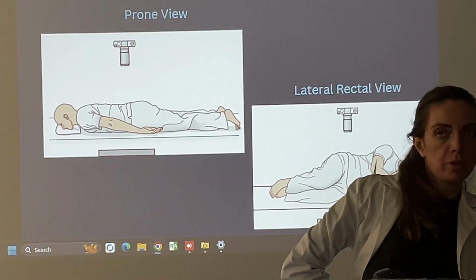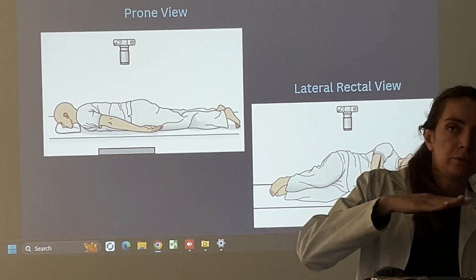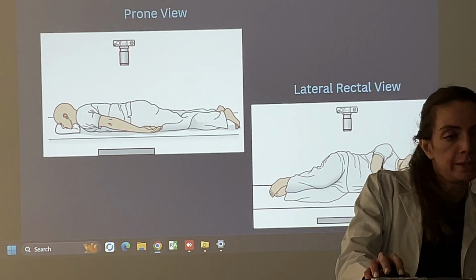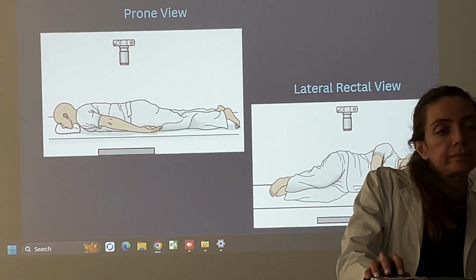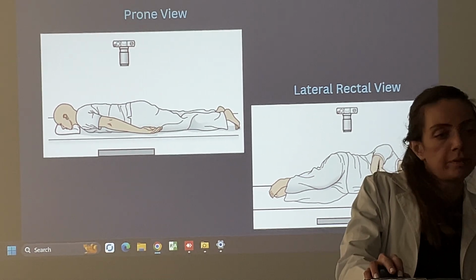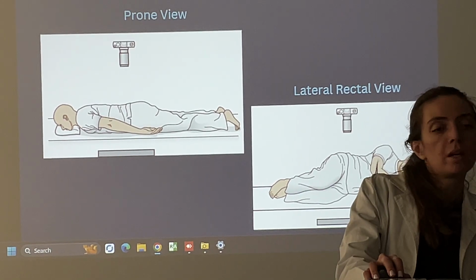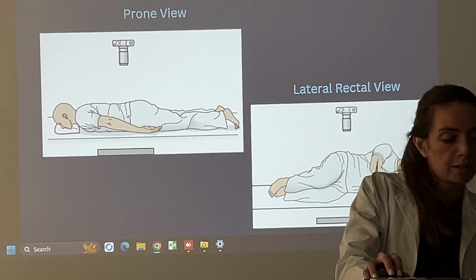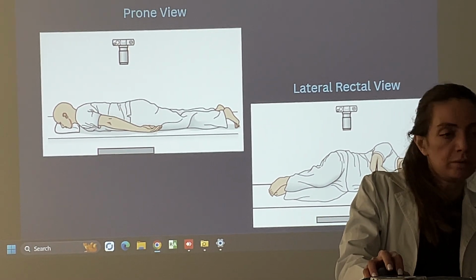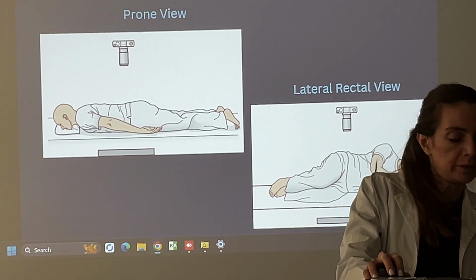Because the rectum and sigmoid are posteriorly located, the highest points of the large bowel when the patient is lying on his abdomen, and air will rise into the rectosigmoid colon. Almost no air is introduced into the rectosigmoid colon during the course of a routine rectal examination.